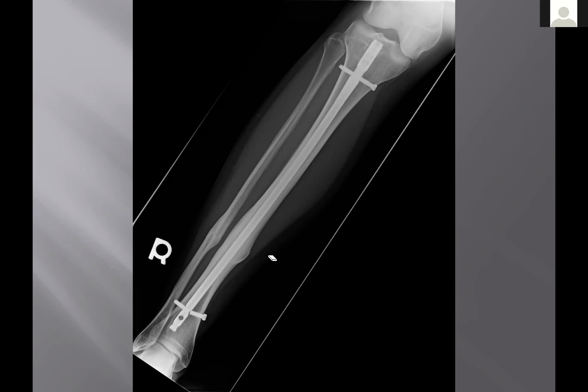No. Okay. Anybody else have any thoughts? Well, it's either no or yes. And one thing's for sure, it's tough to do post-surgical stuff. So let me give you some things. Number one, what do you mean by surgical failure? Let me tell you what you're looking for.